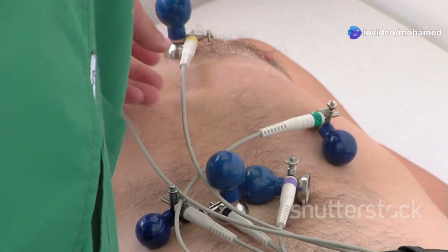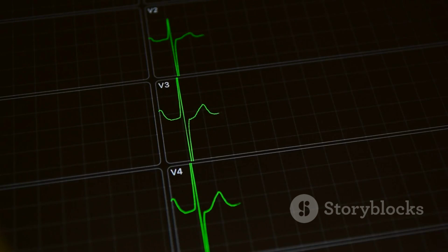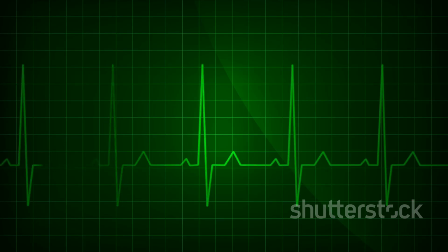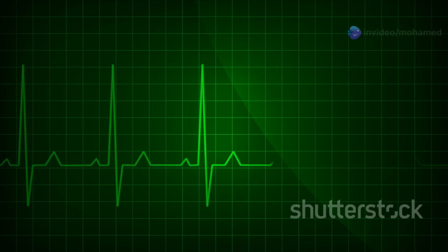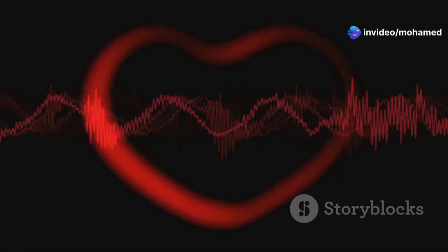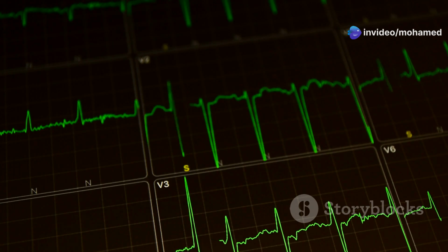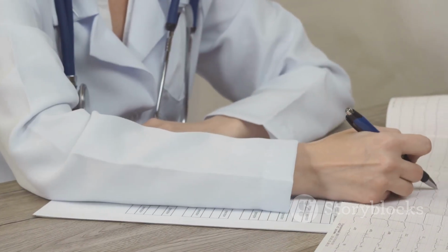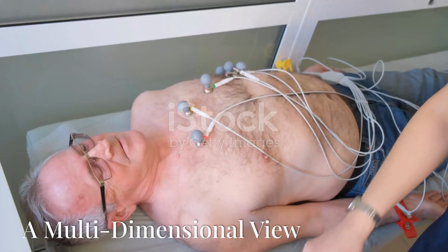The ECG picks up these electrical signals. It displays them as waves and complexes on a screen or paper. Understanding these waves and complexes is key to interpreting ECGs. The heart's electrical system is complex, but we can break it down into simple steps. By learning these steps, you'll be well on your way to mastering ECG interpretation.